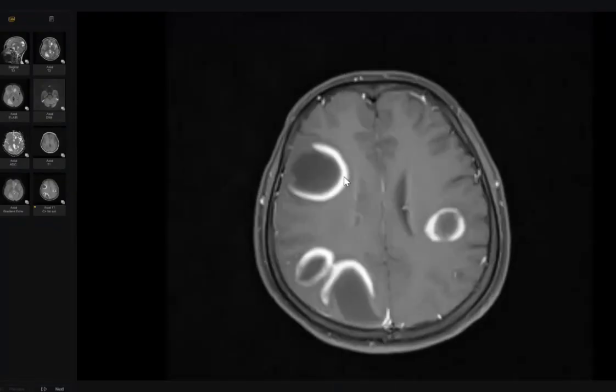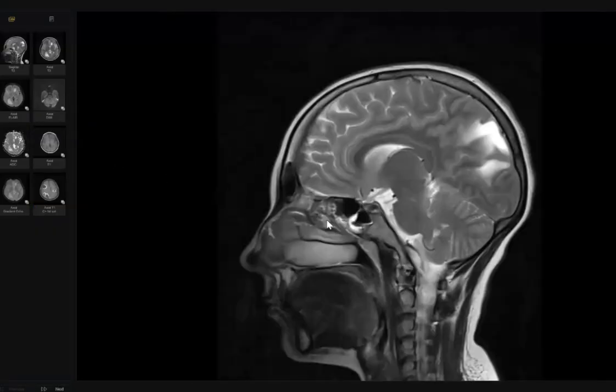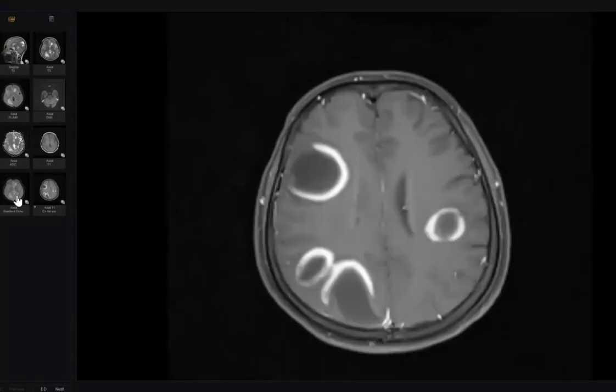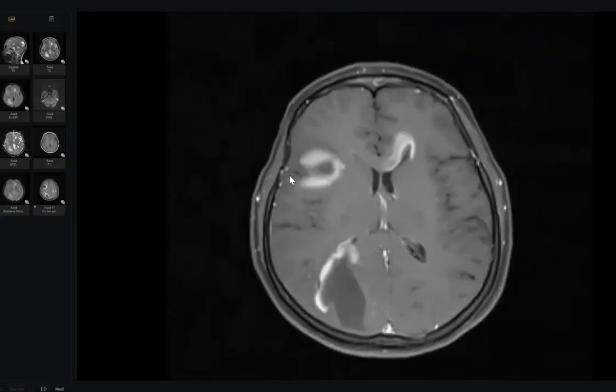Okay. What is the specific name of this type of demyelinating lesion? I forgot the name. It's like eating up the brain parenchyma. No. What else? Tumefactive. Yes. What is the meaning of tumefactive? Like it's eating or liquefying the brain matter, and it's rapidly progressing. No, tumefactive is not eating the brain matter. It is due to another cause.